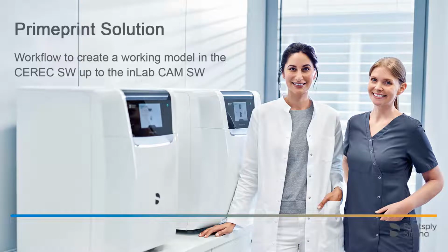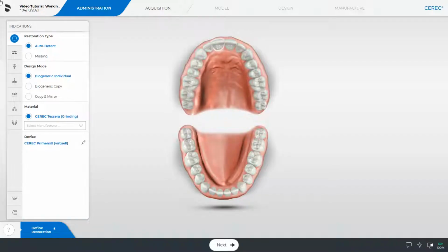Welcome to this video tutorial on the topic of Primeprint Solution. In this video, we will demonstrate the workflow of creating a working model. We will guide you through the CEREC software and the inLab Model app up to the inLab CAM software. In this case, our model concerns 3 front teeth restorations in the upper jaw.